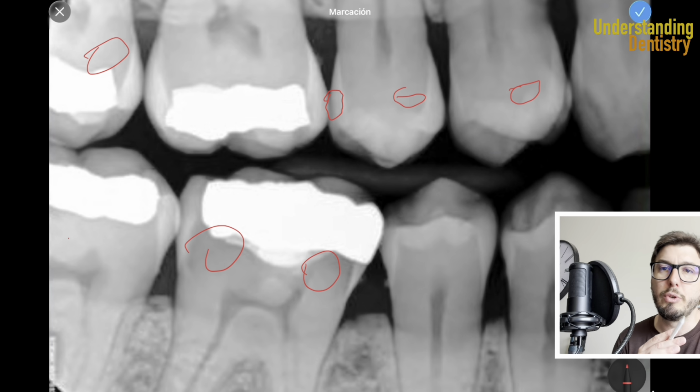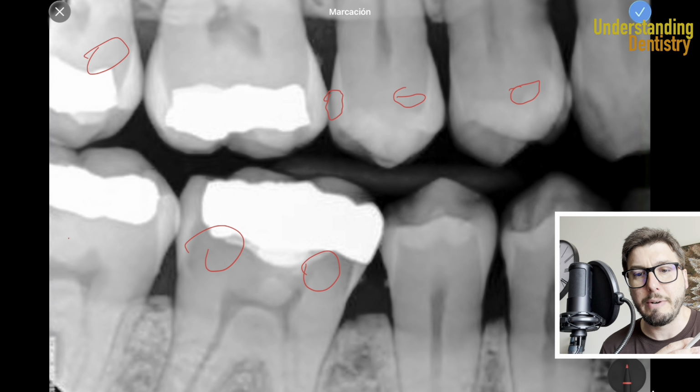But you need to include these teeth better in the radiograph and correlate, of course, with the clinical symptoms of the patient. If you need, then you take periapical radiographs, because if you suspect caries, then you want to see how the apex is, to see if there is periodontal ligament space widening, lack of lamina dura, or any other alteration which comes with inflammation and infection of the tooth.